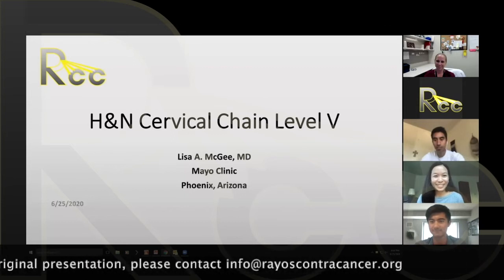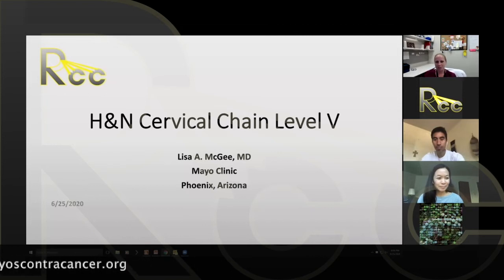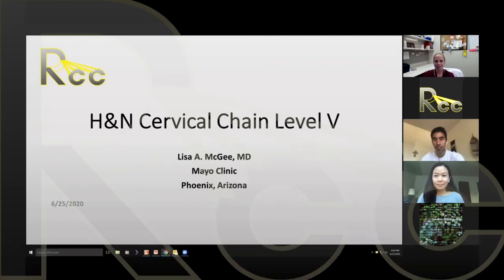Well, thank you. Today, what we're going to be discussing is how to contour level 5 within the head and neck cervical chain. I was able to listen to Dr. Patel's lecture with you guys on Tuesday. I apologize, I did miss the level 1 and level 2 lecture prior to that. So hopefully we'll be adding to what you guys have already learned the last few sessions, and then hopefully maybe even tying in a few concepts as well.